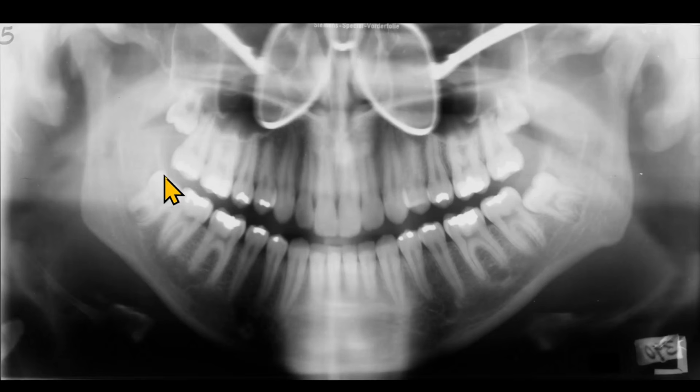See, the chin is tipping down, right? So with this prominent smile and the hard palate pointing downwards, there's a chin down error. And of course, I'm sure you are never going to make a mistake with the eyeglasses.